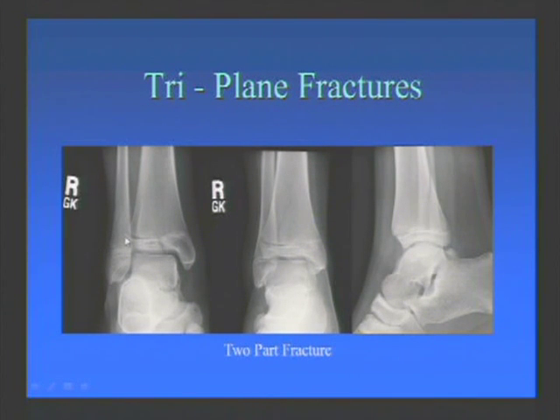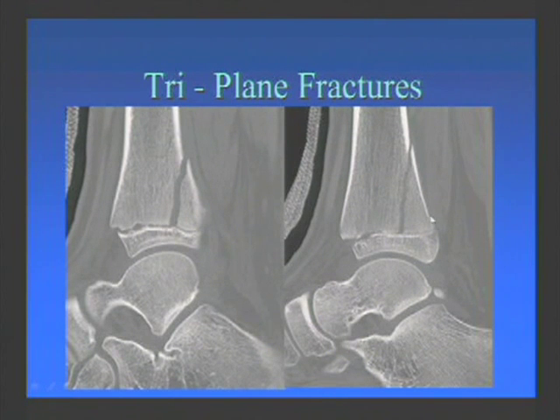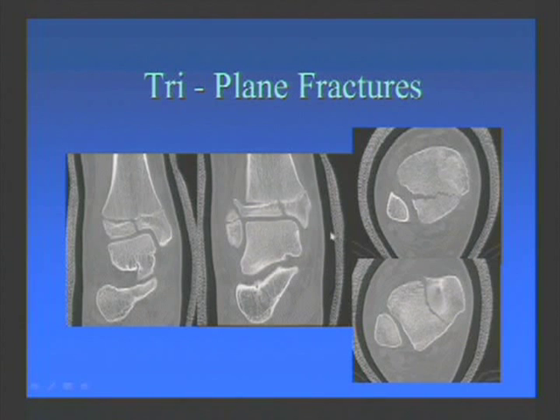It stands out there. Now, on the frontal view, you cannot see the posterior coronal plane fracture, but when you get to the oblique view, you've got it right here. Now, when you do a CT, it shows up a whole lot nicer. And here we've got a nice CT showing the coronal plane oblique fracture through the posterior metaphysis, the axial horizontal component, and then if you have the coronal fracture line, then you can see how it comes in. This one runs in, a sagittal fracture line running through the epiphysis.